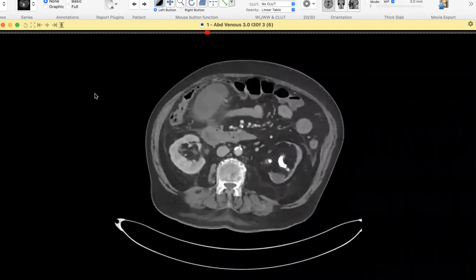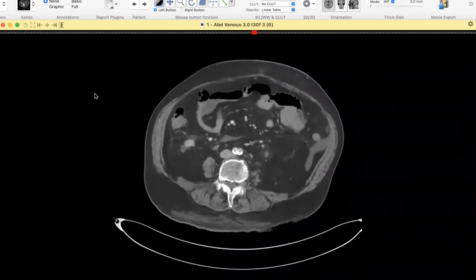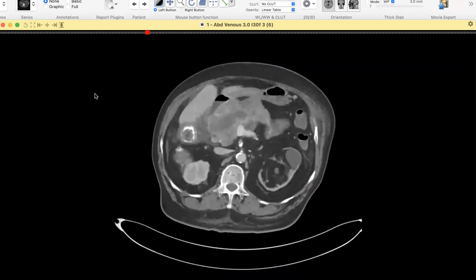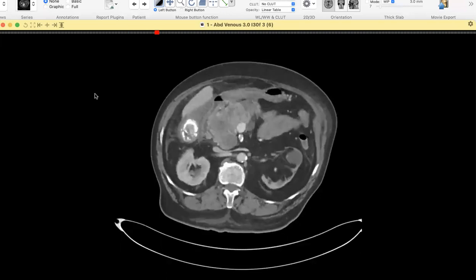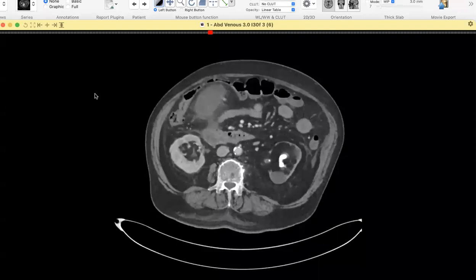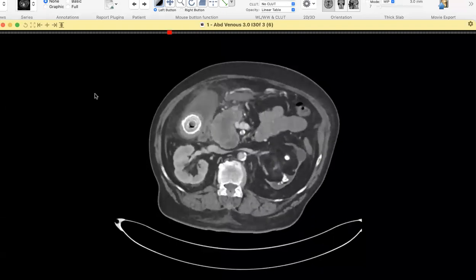Why small bowel? Why small bowel? This is a gallbladder. Yeah, this is the hepatic flexure. No, it is the ascending colon, actually, in the hepatic flexure. Sorry, and there is dilatation. No. Have you identified the gallbladder first?